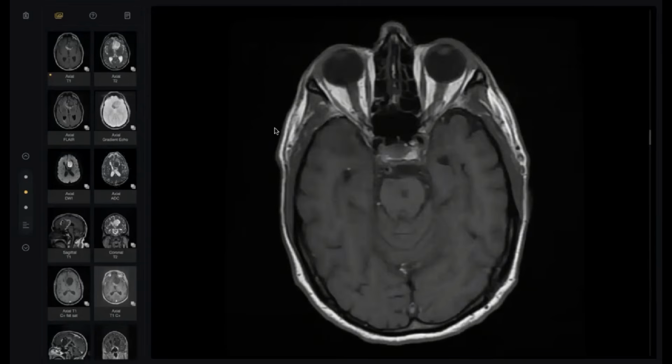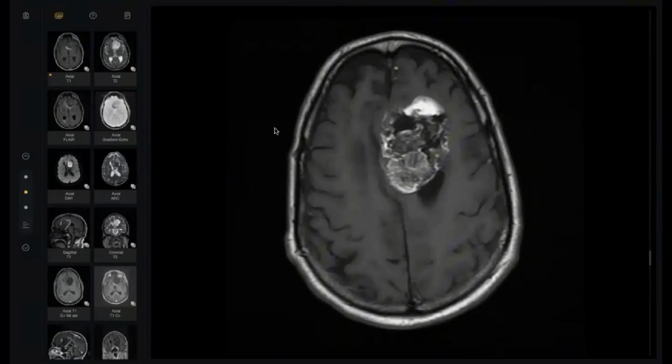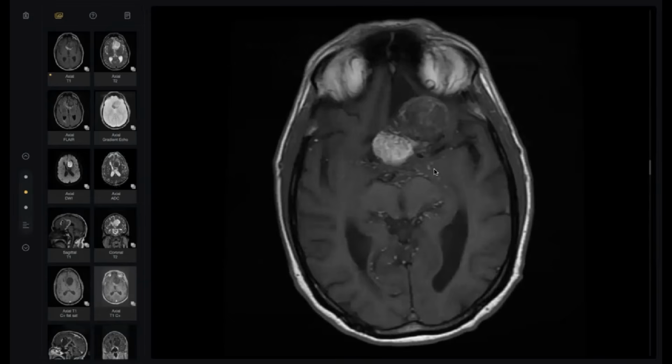Okay. One question, doctor. If you find fat globules here intracranially, and you didn't find the dermoid cyst or any fat-containing lesion here in the brain or intracranial. What is your next step?